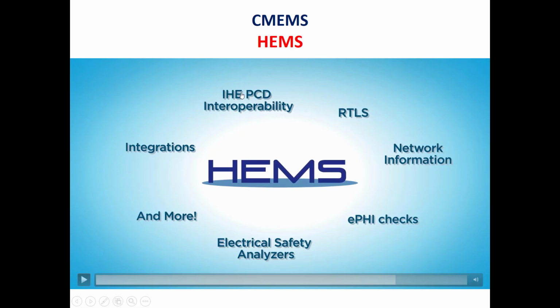Another feature of the HEMS system is the RTLS, an acronym for real-time location system, the network information, and also the electronic patient health information checks.